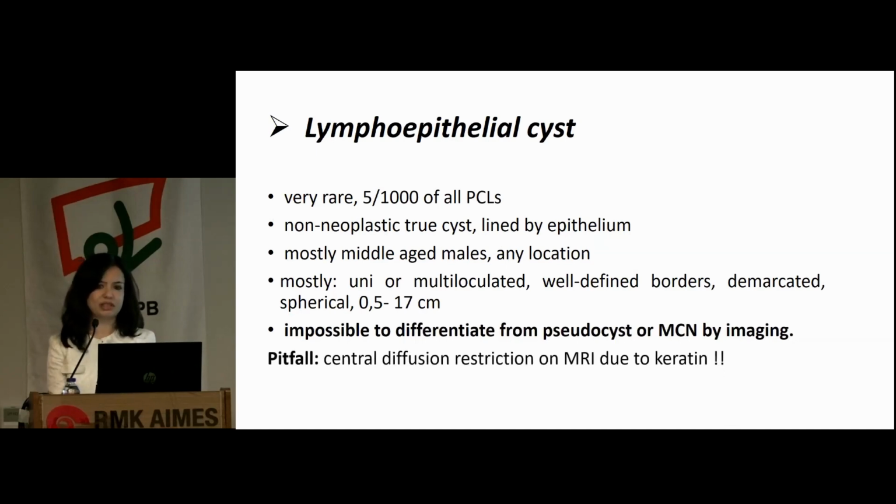Here, the main pitfall is, normally in radiology, if some lesion is restricting diffusion, it means there is increased cellularity, and it is mostly on the neoplastic side. But lymphoepithelial cysts will restrict diffusion due to their keratin content.